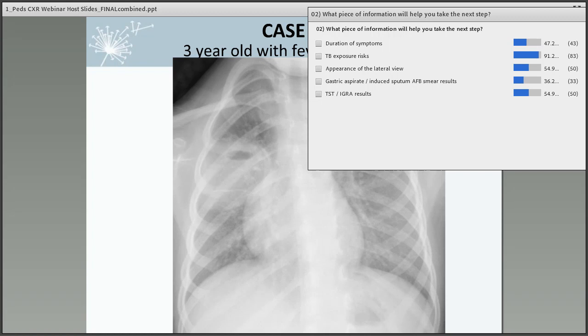So that's a great question. I guess Dr. Wu, we could ask him to comment on that. But when we see something sort of circular like this, we ask the question, could she have a bronchogenic cyst or a pulmonary sequestration or something that might have become infected?